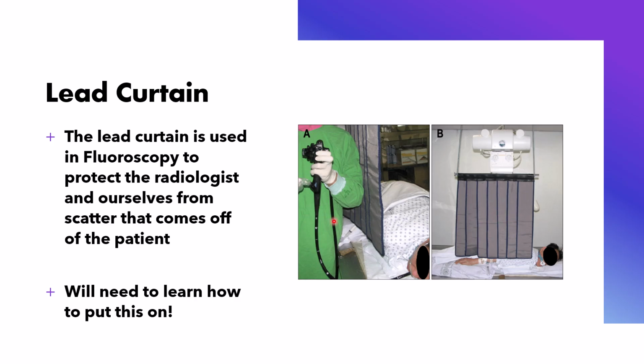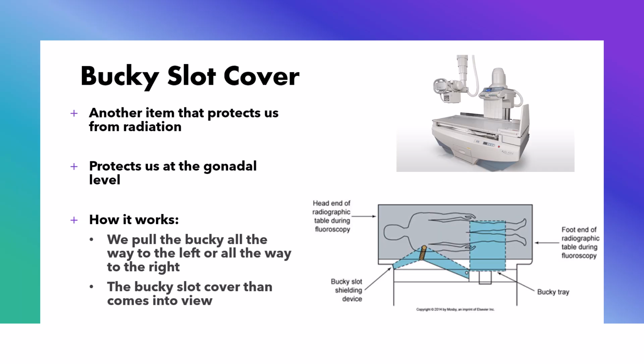I remember when we started using these, and that's to protect the person who's doing the fluoro. And there's a Bucky slot cover. It's right along here. This is the Bucky. That Bucky can move up and down here. When you move the Bucky down, this is the x-ray tube when you're doing fluoroscopy.